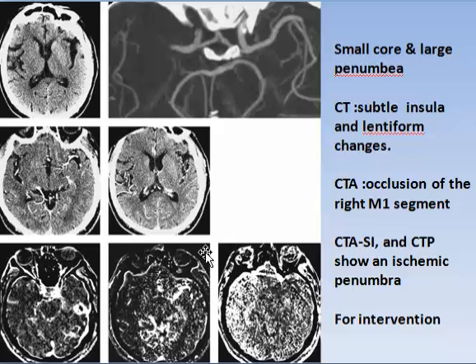And this needs intervention because the region seen as a core is small, while involving the region of the lentiform and the frontoparietal region, while the penumbra seen in the source image and in the blood volume and the blood flow is very big, involving the whole frontoparietal and partly the temporal.